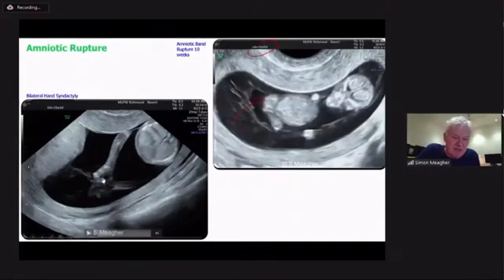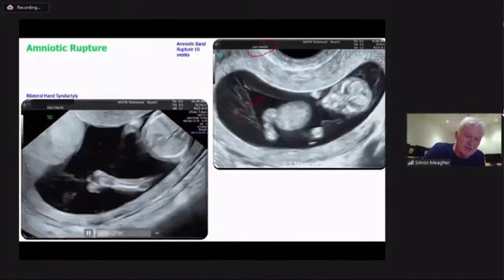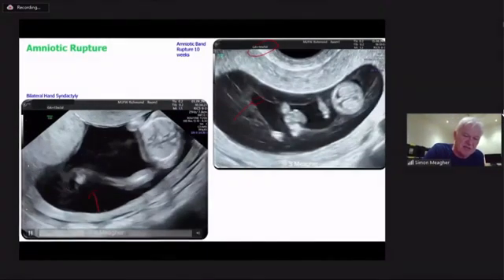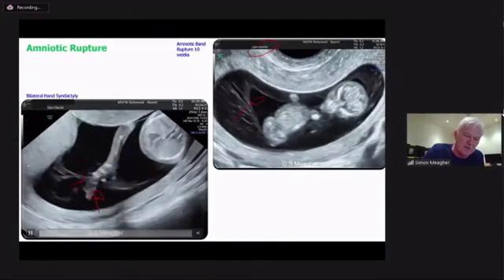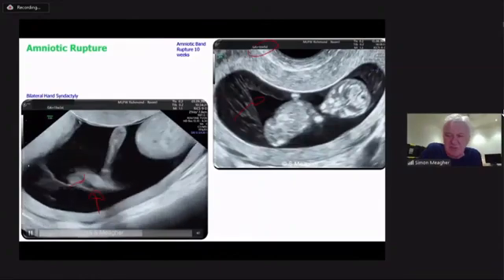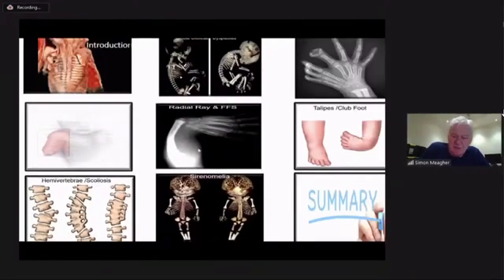This is the same patient here at 13 weeks gestation, 3 weeks later, and now you can see the syndactyly, oligosyndactyly of the arm here, the hand here. So the 4th and 5th are fused. And then there's 2 other digits. So, around to radial ray deformity.